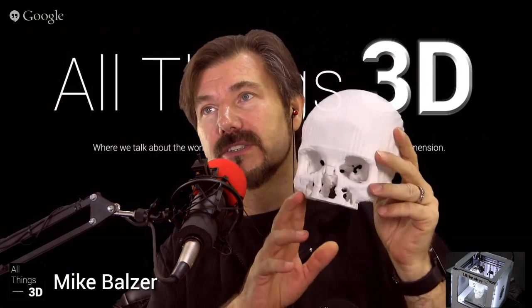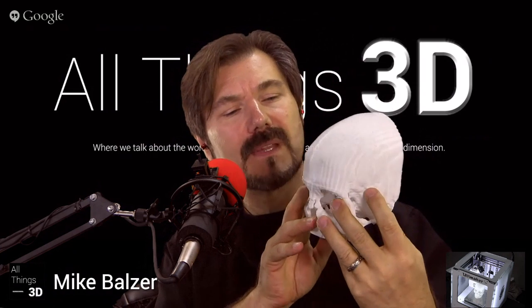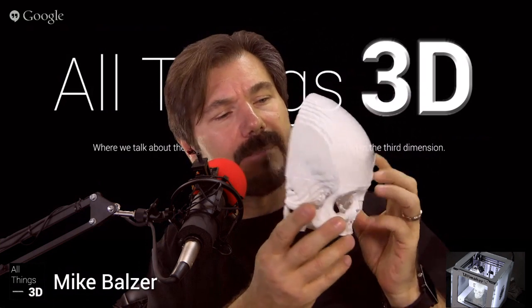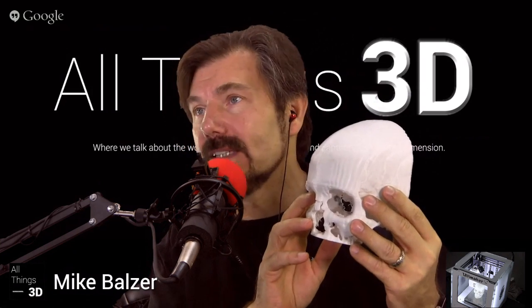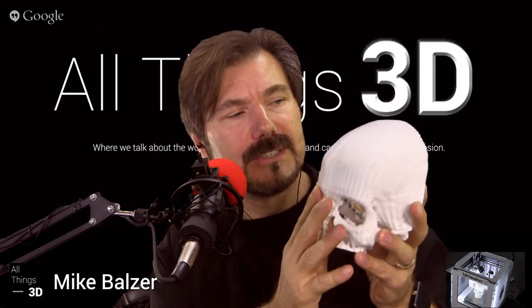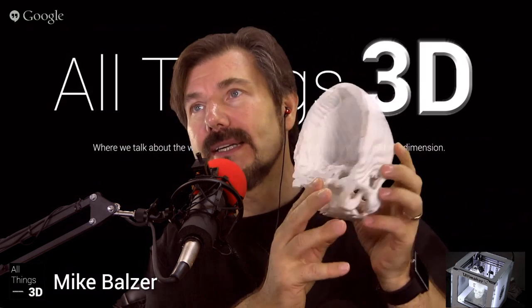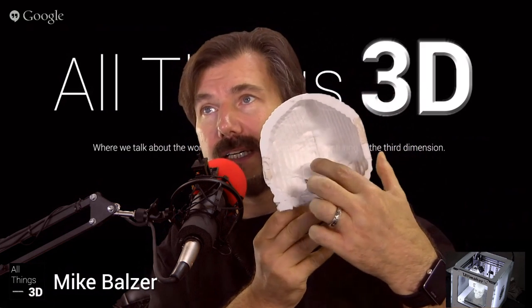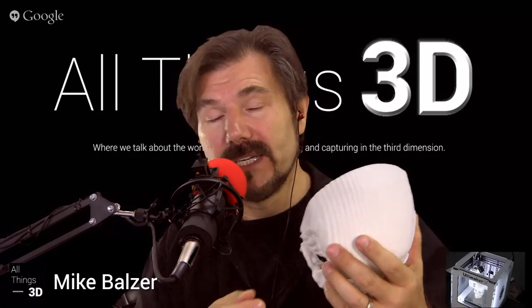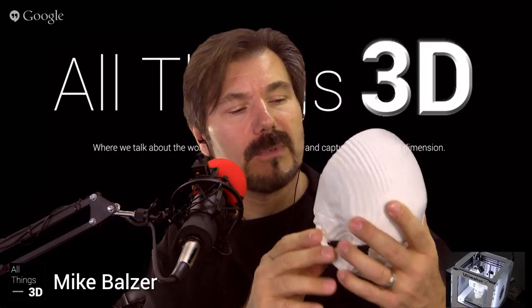So let me show you the first model. And this is the one that you'll see in the TEDx talk when it finally becomes available. This is the first model that I created. And this was, I think, 3mm slices. And you'll see once we get to the data that Jevin sent me that the particular model we were looking at is 1mm. And the big difference is you'll see some ridging. And the reason for it is because it has a coarser definition than some of the newer CT scans, or how they were adjusted. But inside this, you can see the tumor that she had, right there. And what I felt the power was, especially for me being a novice, is that I could actually touch and be able to describe the anatomy, look up things on Google and so forth, but have a model in front of me.